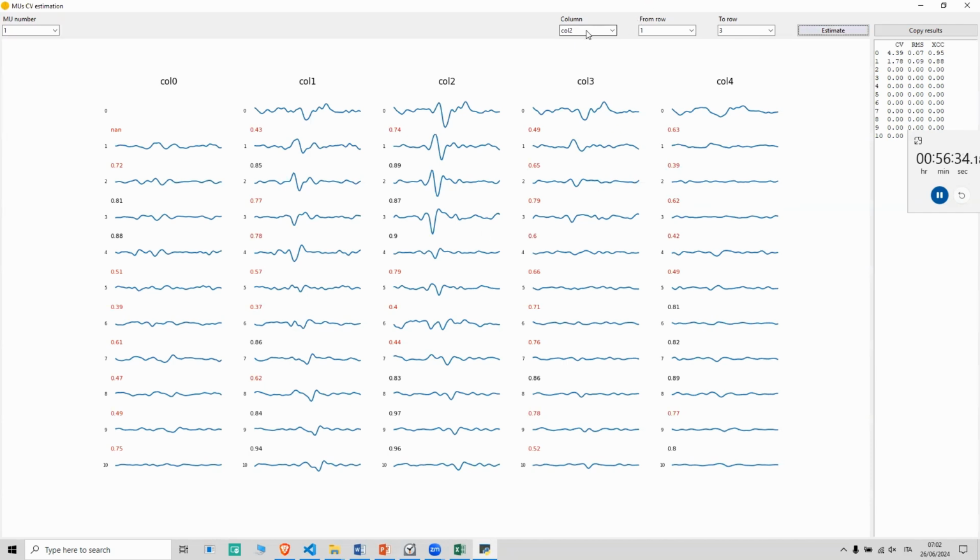So in this case, we could go for column number 2, same column. Let's see here, channels from 7 to 10. We see this action potential, and in some way a propagation from this channel to this one, to this one, and this one. So we would select column number 2 from electrode 7 to electrode 10. And 4.88, which falls within our physiological range.